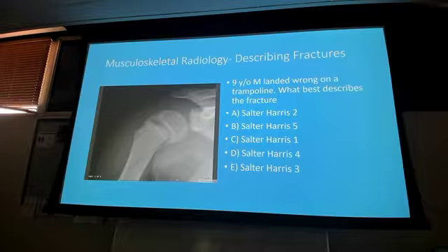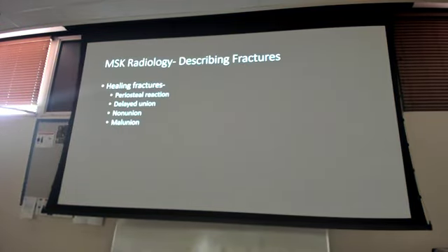Pediatrics can be tough because they're not fully formed yet. So if I give you guys any dislocations, they're going to be extremely obvious or they're going to be adults. Everybody see the one though? See how the ice cream cone is slipping off? Right? Okay.